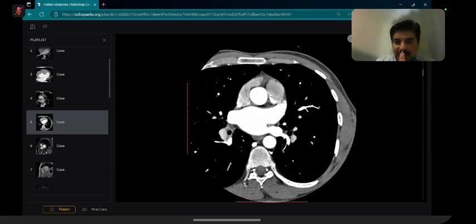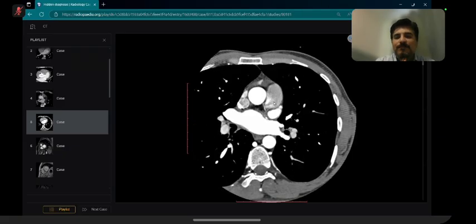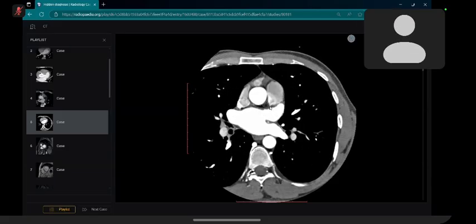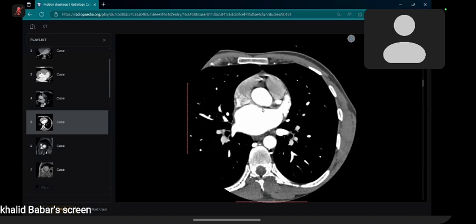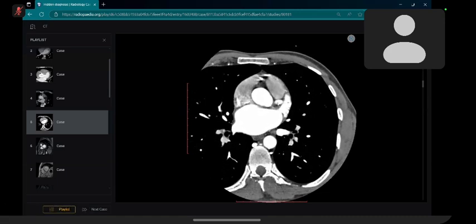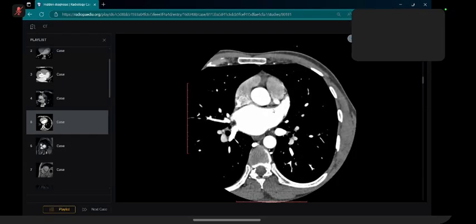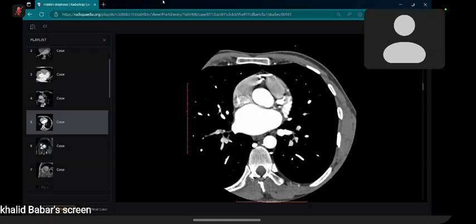Now can you trace the origin of the left coronary arteries again, please? Yes, sir. Sir, it is arising from the pulmonary trunk. Yes, good, excellent. Now, can you stop scrolling? Should I give up the control? Yes, please. Okay, thank you.